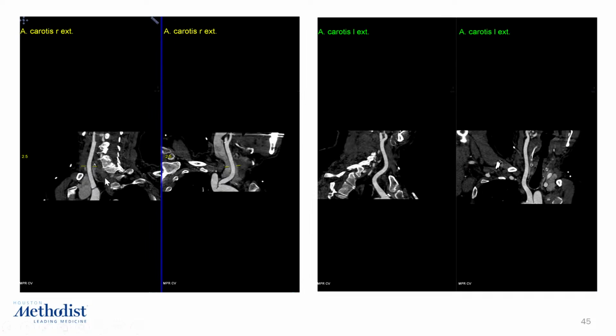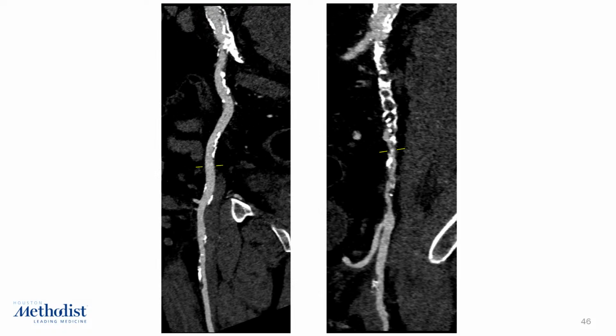You can also, because at least at our site, we also look at the carotids. So you look at the left side, the right side, the internal, external, and the common carotid. Look at the subclavian. So all these potentially can be access sites.